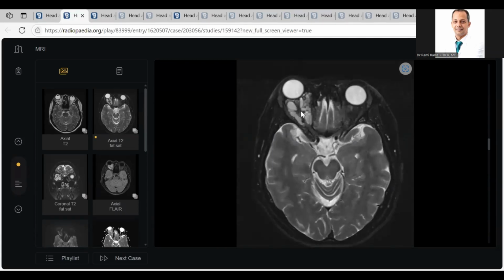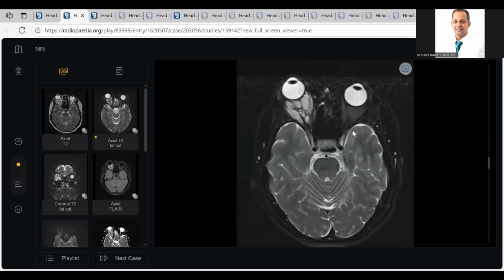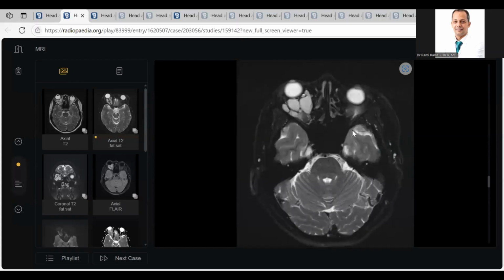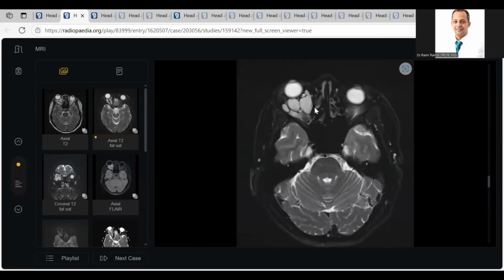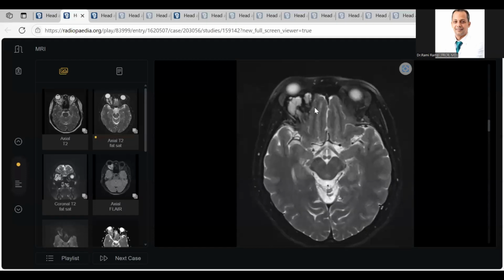This is a lymphatic malformation, but tell the examiner that you are a safe radiologist and you know your differential, how to differentiate from each other. Second point, this is non-enhancing. Here, I show you one section. When the examiner shows you one section, the answer is within this section.